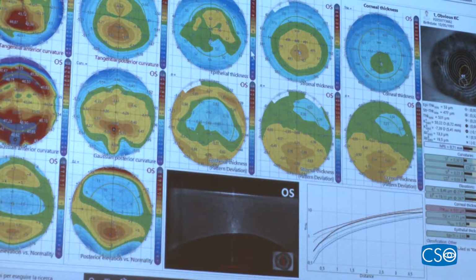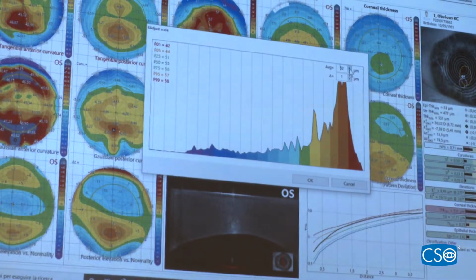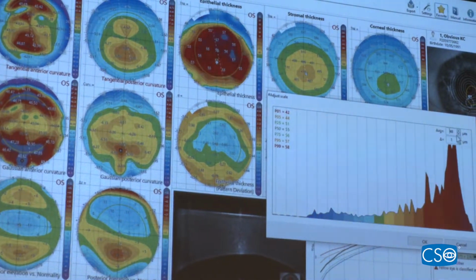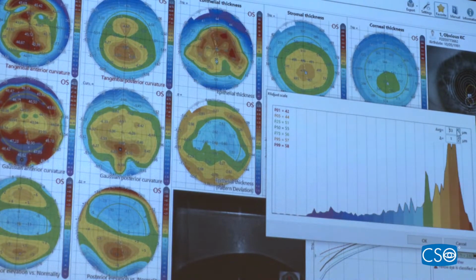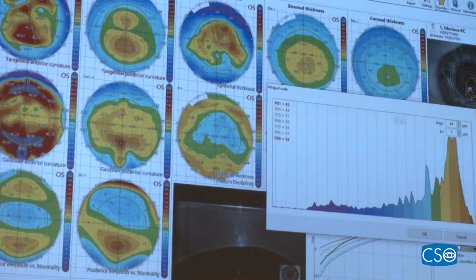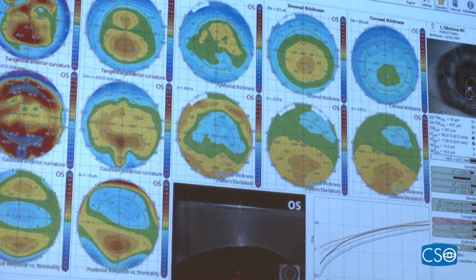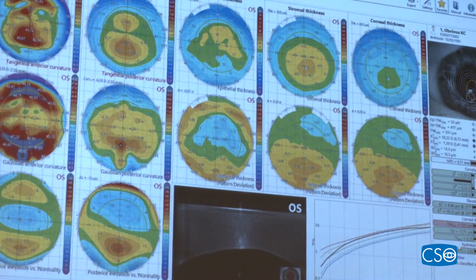So, again, we normalize the scale here and adjust it so that we can emphasize any irregularities. That looks okay. Well, maybe here, you see, maybe here. Okay, and now I'm looking on the horizontal lines. Oh, sorry, I didn't finish.